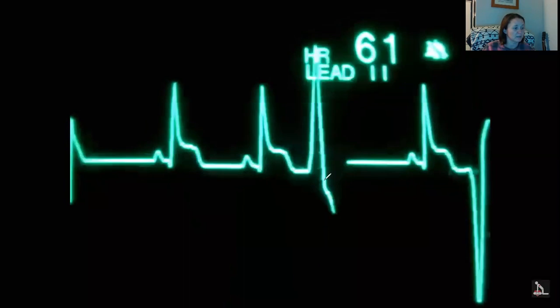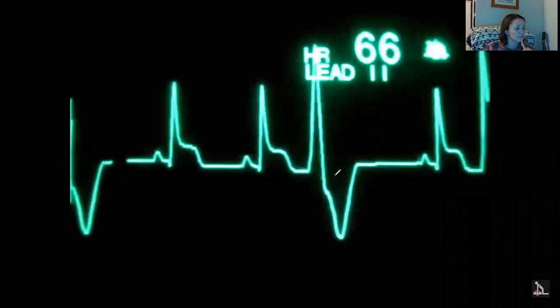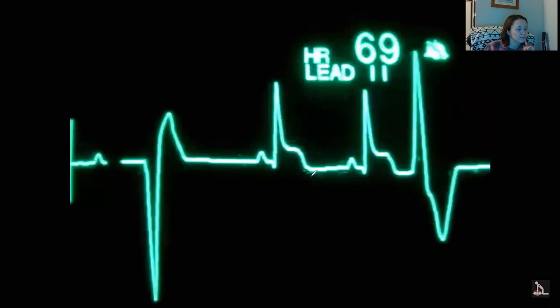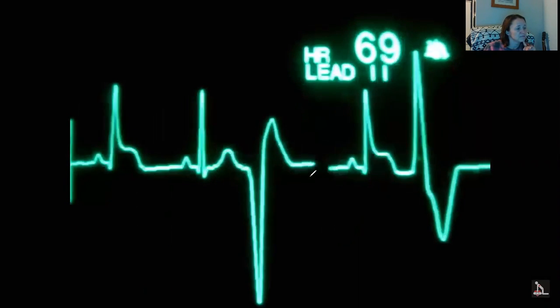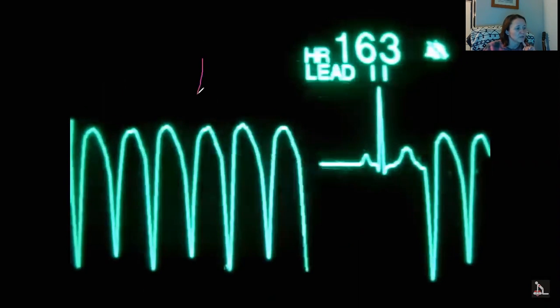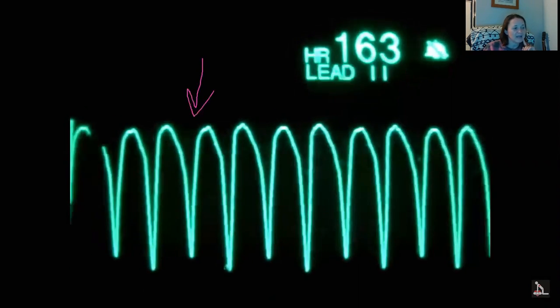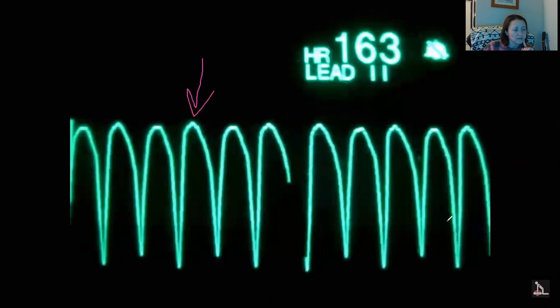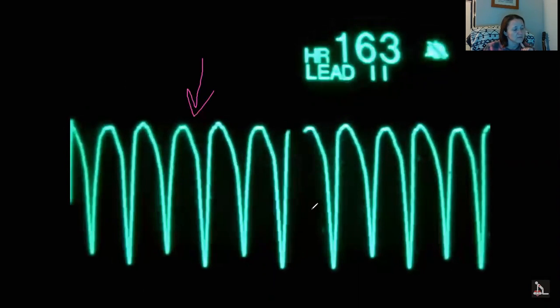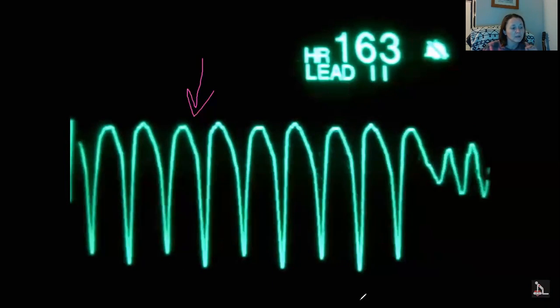That's not good. Uh-oh. Okay. VTAC. So this could be with or without a pulse, but it's a regular pattern.